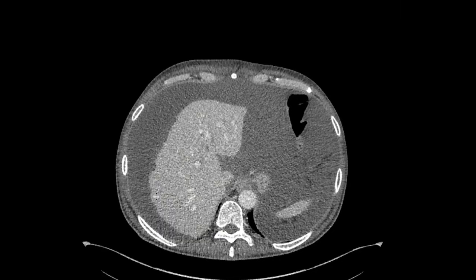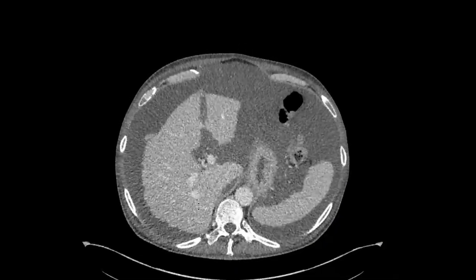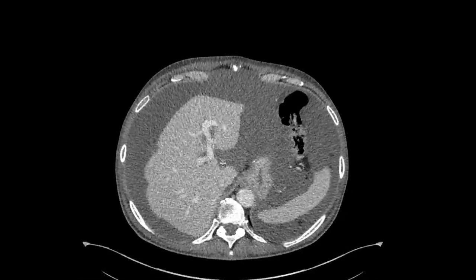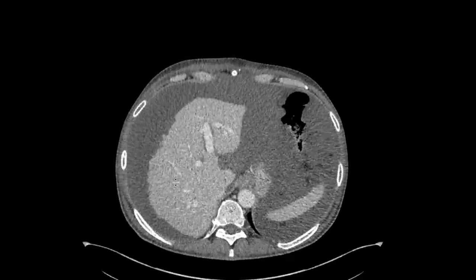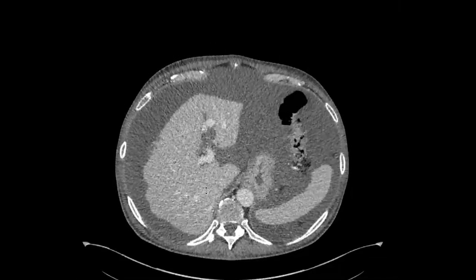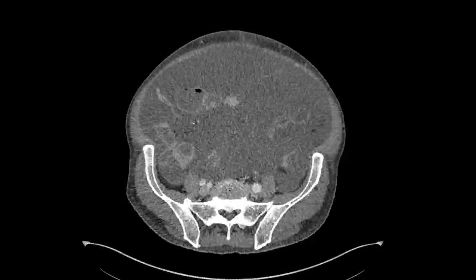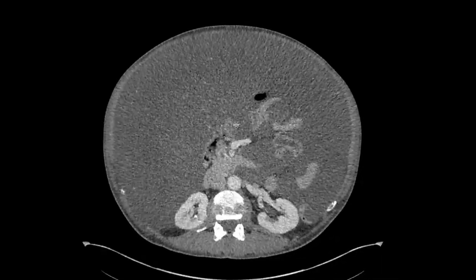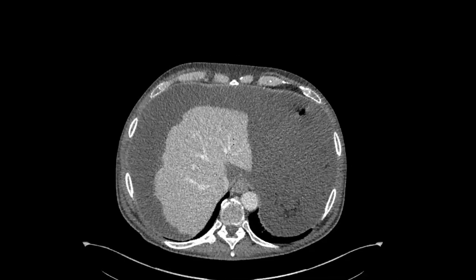And here you can see the liver looks scalloped in appearance. And so that's fairly typical of pseudomyxoma peritonei. It can almost look like this patient has cirrhosis, with surface nodularity, but things that don't really support that is the portal vein doesn't look particularly dilated, the spleen isn't particularly enlarged, and this history that the patient is given of a mucinous neoplasm of the appendix strongly suggests that this is pseudomyxoma peritonei.